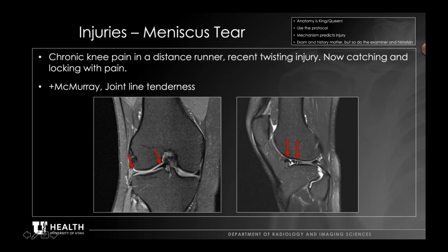You should only have one triangle anteriorly. In this case, we actually have two. So one of these is the torn meniscal fragment that is just flipped onto itself, just kind of like a bucket handle can flip back and forth. And causes major problems, requires surgical repair.